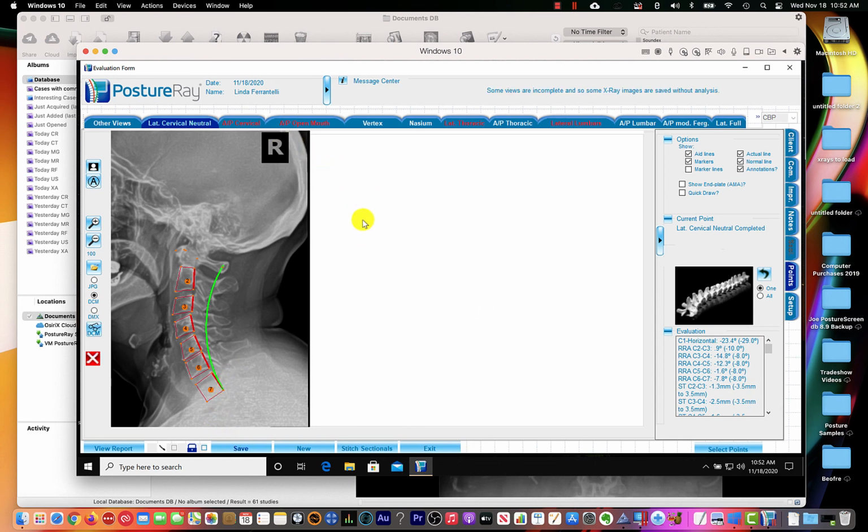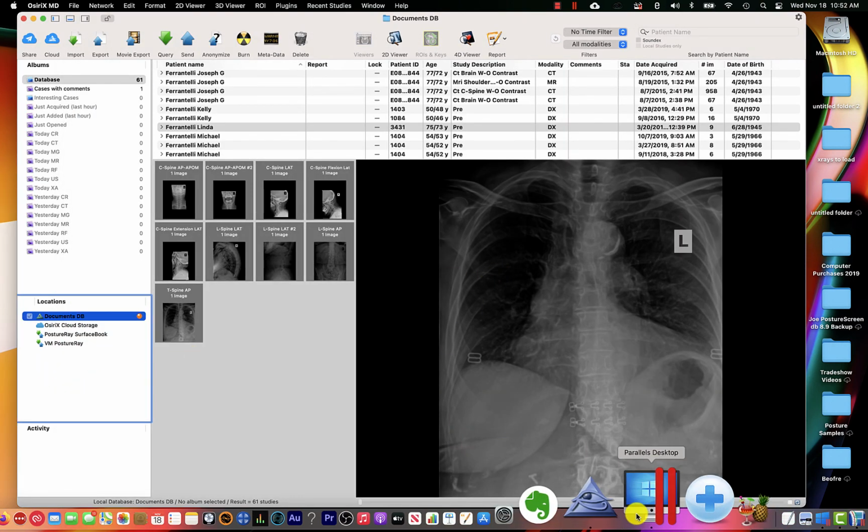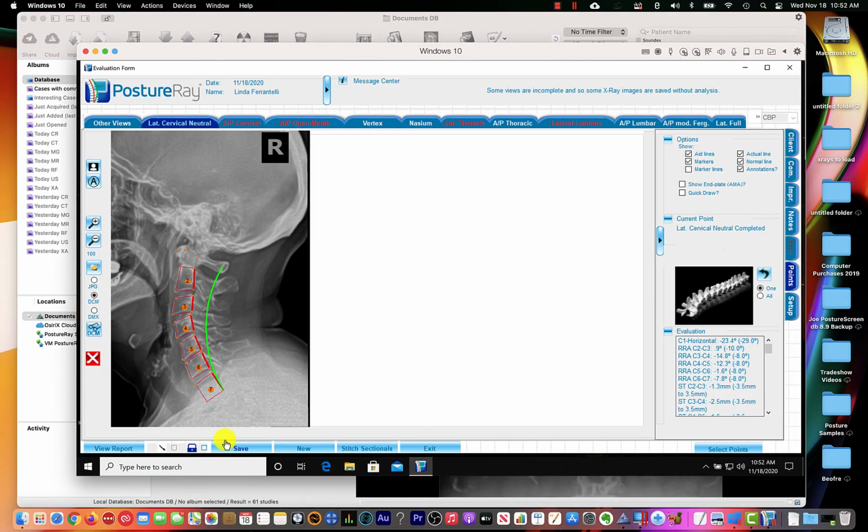We have tutorials on all the rest of the views and everything else. So the purpose of this was to basically just walk you through how to send from a PACS software system over to PostureRay. Okay, it's as easy as that.